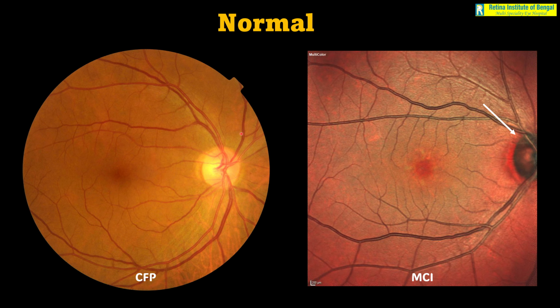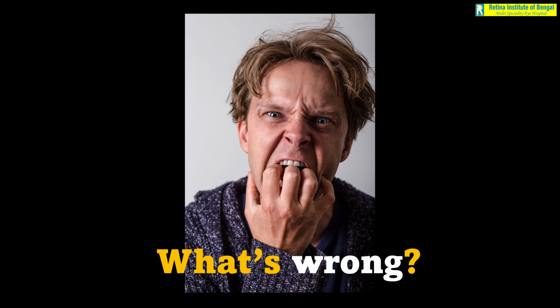Even for a normal fundus, like in this case, if we look at it with a multicolor image, even here the disc looks black, which we know is definitely not the true color of a disc. In other words, it was very obvious to us that our approach towards multicolor imaging was wrong. This is not a color fundus photo. So why were we going wrong? We realized we needed to dig deeper and understand the technology before we could apply it the right way in our clinics.